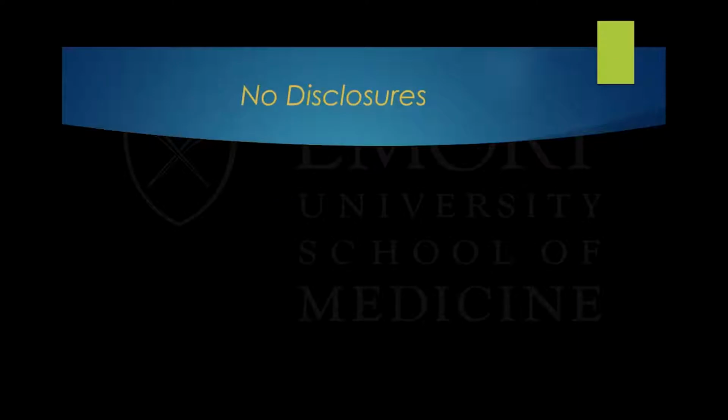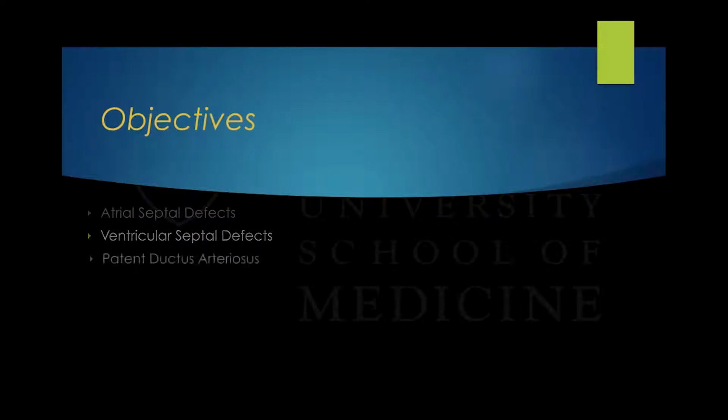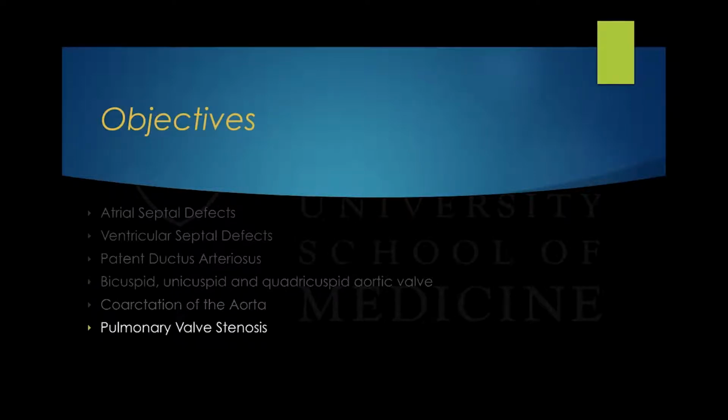I have no disclosures. The objectives of today's meeting will be understanding the echo features of the atrial septal defects, the ventricular septal defects, patent ductus arteriosus, bicuspid, unicuspid, and quadricuspid aortic valve, coarctation of the aorta, pulmonary valve stenosis, Cor Triatriatum Sinister, and anomalous coronary.